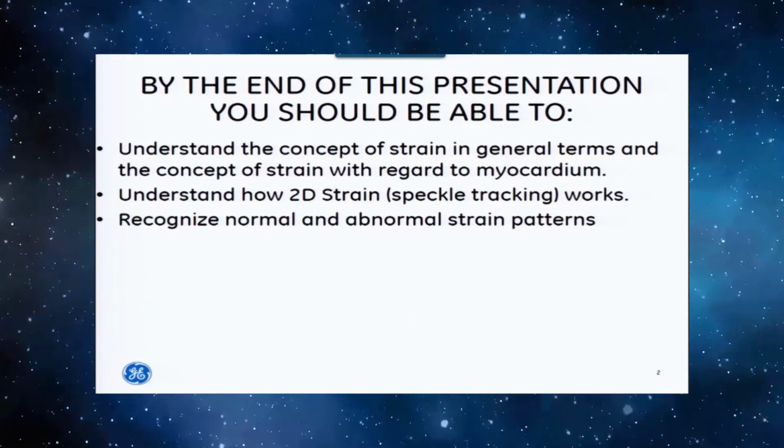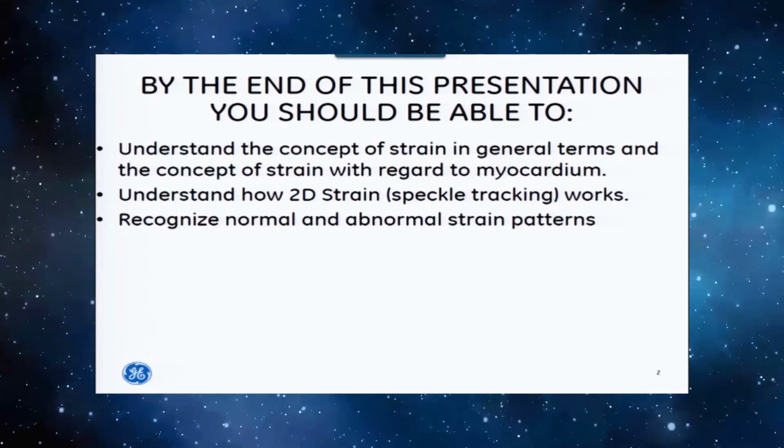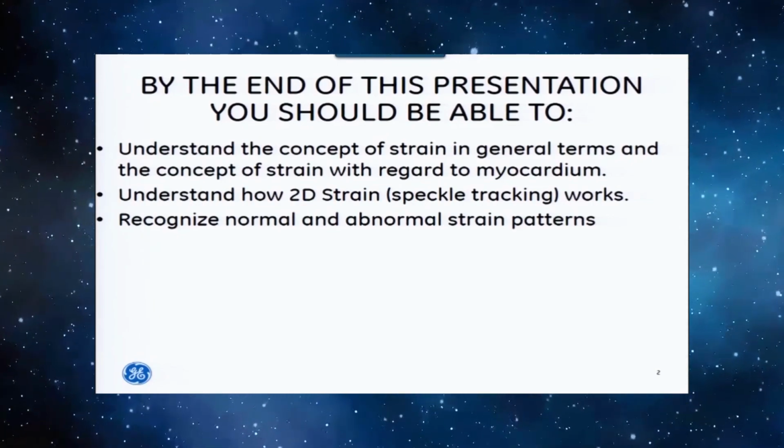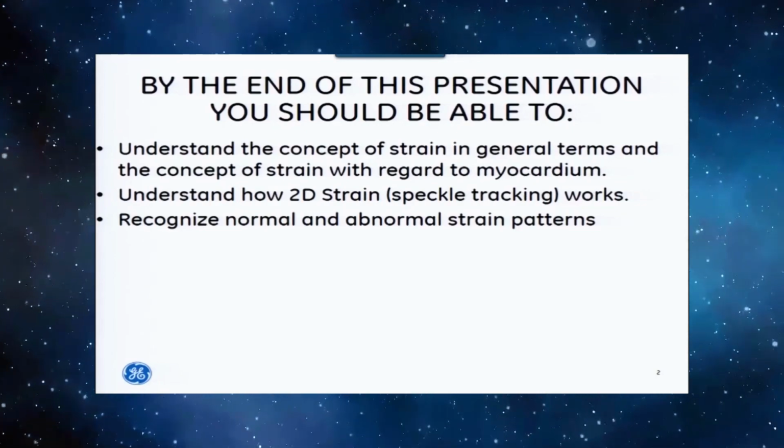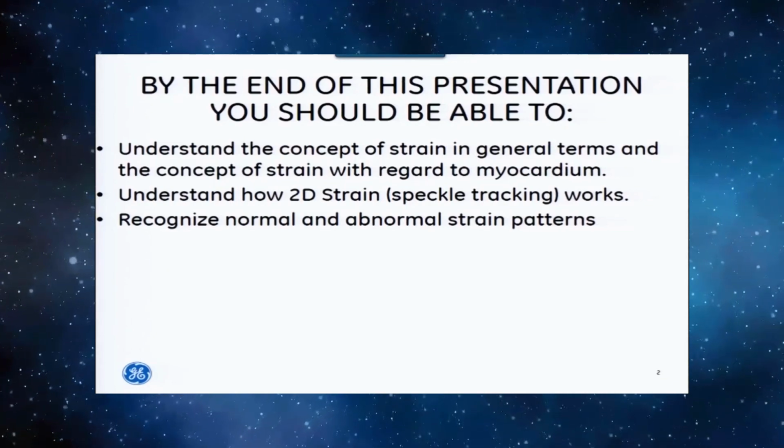We want to talk about how we calculate strain. How does the system come up with these strain numbers, i.e. speckle tracking? And then we're also going to go over what constitutes a normal and an abnormal strain curve.